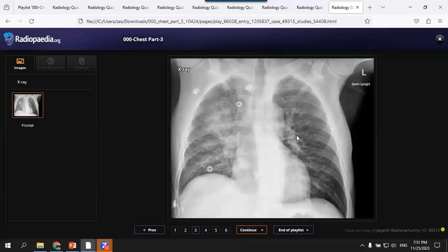Unilateral pulmonary edema may be positional, or due to acute mitral regurgitation. At Egyptian exams, they love this case, by the way. Because the flow after mitral regurgitation will be directed to the right upper lobe.